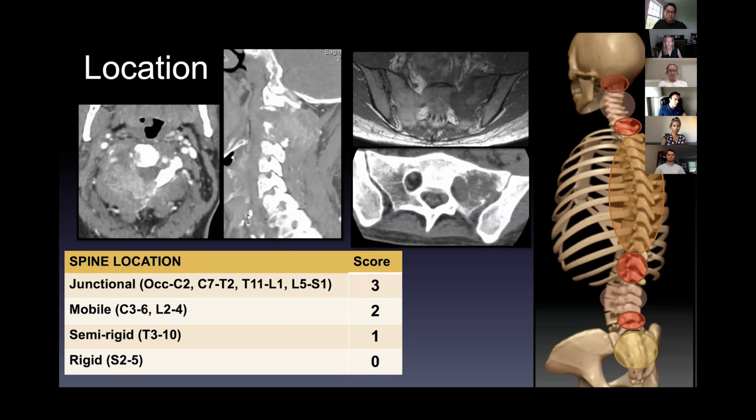Yeah, sorry, I don't have more pictures. It's not C1. It's a subaxial spine, but you can see that it basically completely encases the vert on the right. And I'm assuming that if you were to get additional imaging, potentially upright x-rays, you would see some degree of kyphosis or something that's suggestive of instability.